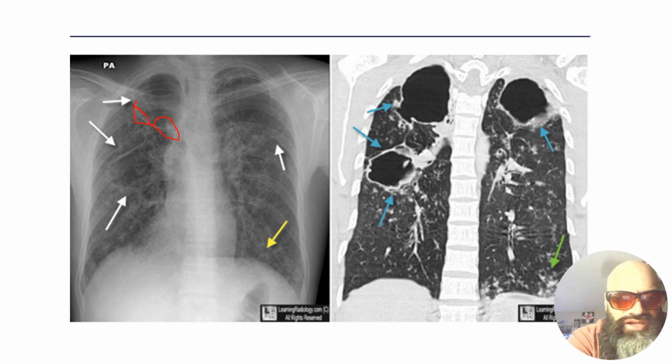X-ray. So etiology of the cavitary lesion could be from tuberculosis nodules or complexes that we discussed in the course, abscesses that are filled with purulence and other substances, and fungal pneumonia, as well as tumors. So anytime you see any type of these cavitary lesions and the patient's presenting with symptoms of tuberculosis, that's going to be your clear shot answer to the question.